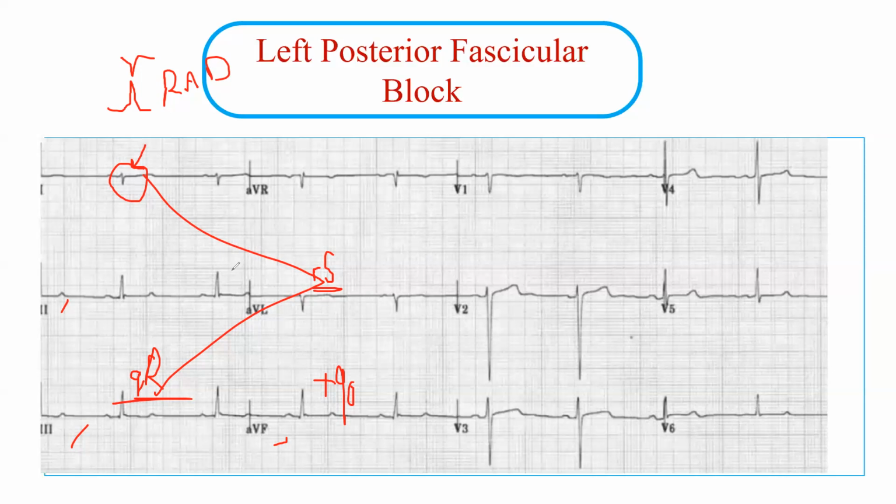Now, this is very important actually. If you look at the leads here, the QRS complex, sorry, is normal in duration. The QRS complex is normal in duration, and this is also a suggestive feature of left posterior and even left anterior fascicular block. And thank you.